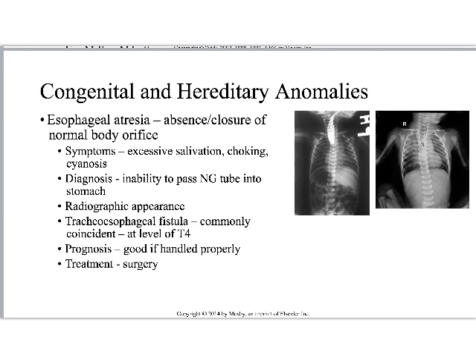And then they take an x-ray and we've proved that this kid has esophageal atresia. This is commonly done in pediatric hospitals because it's a much easier way, with lower radiation, to diagnose it than with CT, right? So if you wind up doing peds, this might be coming your way. That is the way that it's proved, or they might have the patient swallow a little bit of barium or something that's not barium based in terms of contrast.